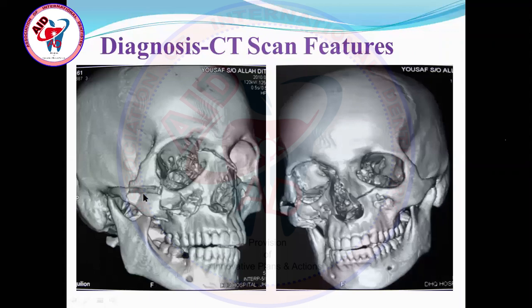3D scan of another patient. There again, it's also an atypical fracture. Fracture through the body of the zygomatic bone and the lateral aspect of the infraorbital margin, and at the junction of the arch with the body of the zygoma. But the frontozygomatic suture is intact. And there is fracture at the infraorbital margin also, along the maxillary sinus also, here at the nasal aperture also, at the junction of the frontal process of the maxilla with the frontal bone also, and at the zygomaticomaxillary buttress region also.